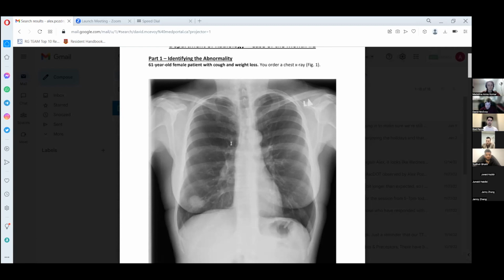We'll get to see a bit more of cases later on, and you'll probably see lots of those where you actually do have hilar lymphadenopathy or something else in the mediastinum causing a bulk. But in this case, this is quite unremarkable, as we can see.